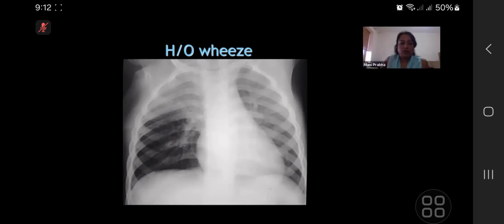Okay, I'll sum up the findings for you. See, the mediastinum appears to be slightly shifted to the left side, and it can be difficult, because the projection might be different. So for you to understand, since I know the patient, I know the disease also, there is some lucency in this area, in the right middle zone and right lower zone. And there is some haziness. It's probably projectional haziness on the left side.